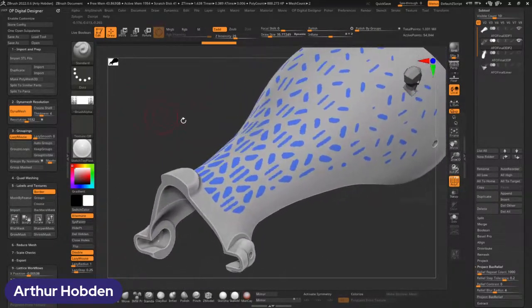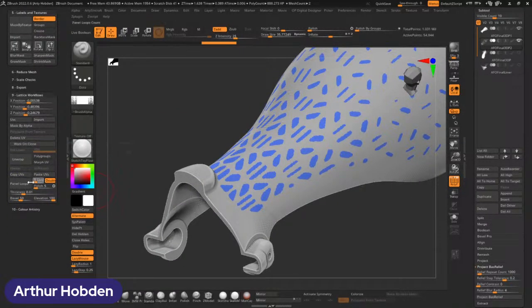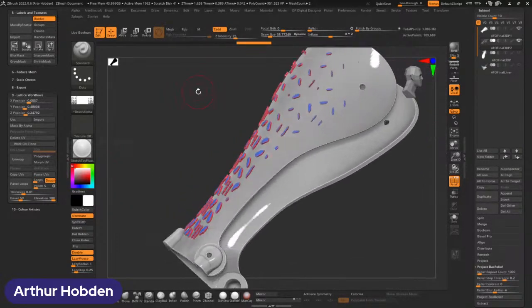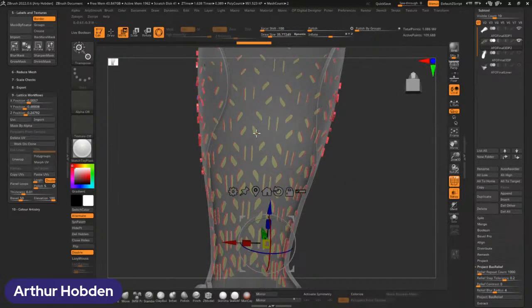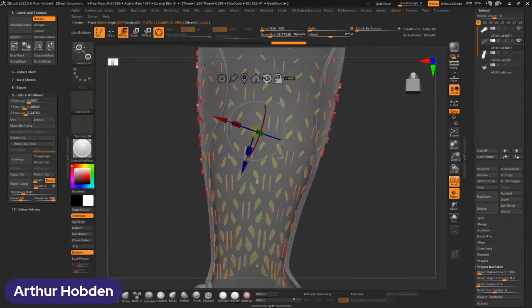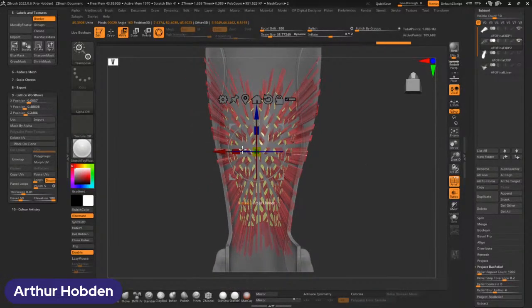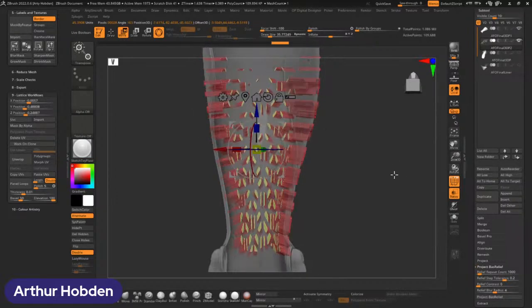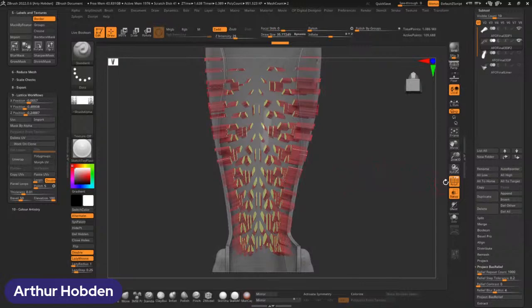This is really interesting because now, as a duplicate, we can go and panel loop this piece. What that does is it gives those surfaces thickness. And those thicknesses can be used to cut into another solid, but they have to be separate, right? So that's why we made a separate group. So I'm going to quickly scale these pieces so that they come into the part just like this.